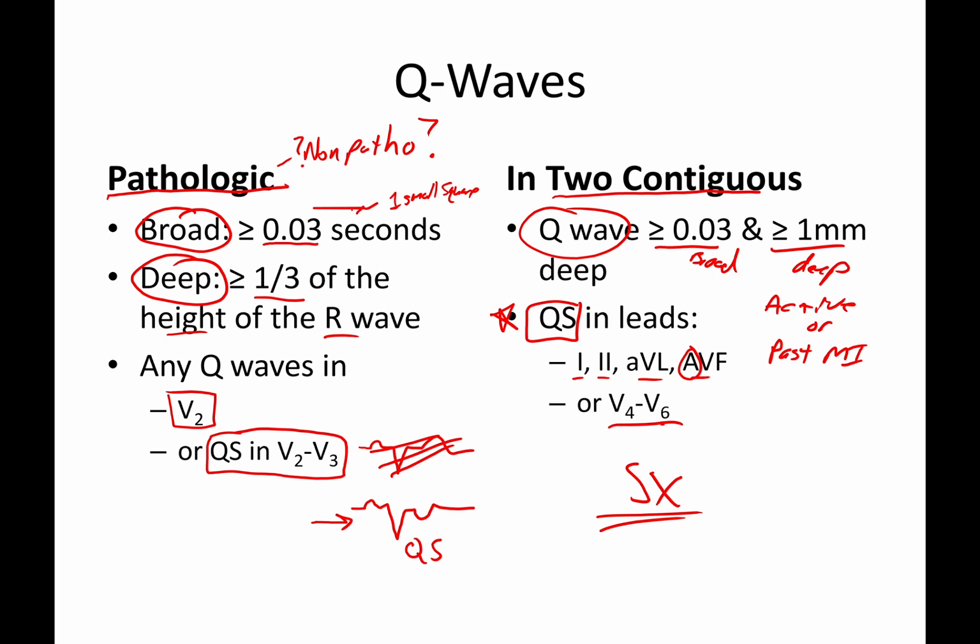Other things worth noting, patients who have an MI with Q waves have a higher incidence of mortality, an increased amount of dead tissue, and more likelihood of developing CHF or heart failure. Without aggressive treatment, a small infarct can become a big one. So seeing new Q waves is something that's always worth digging into.